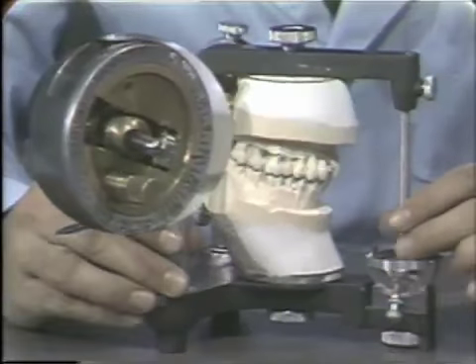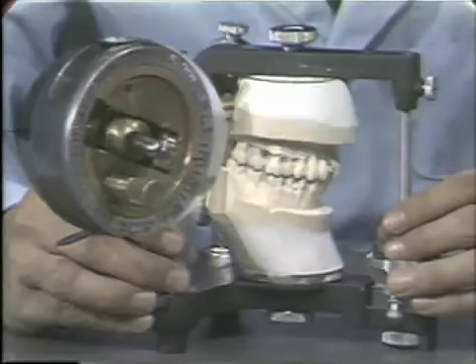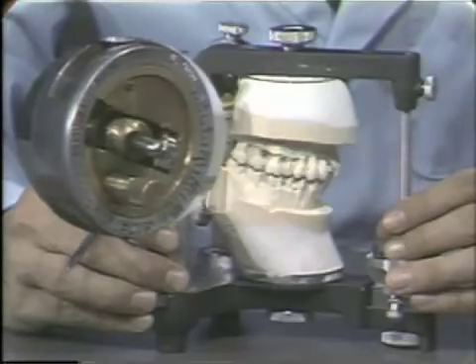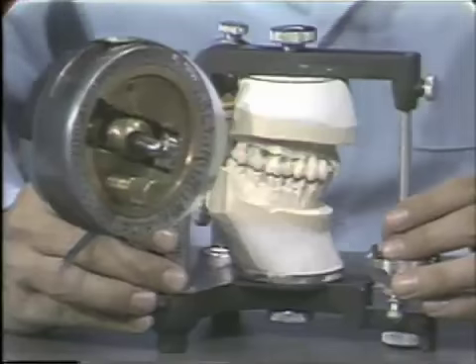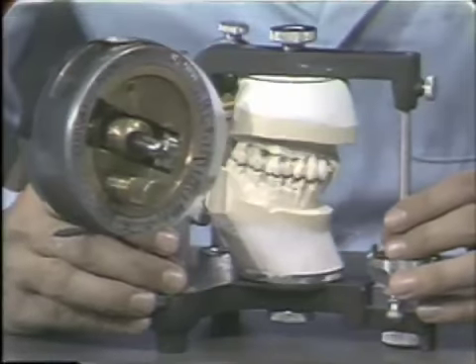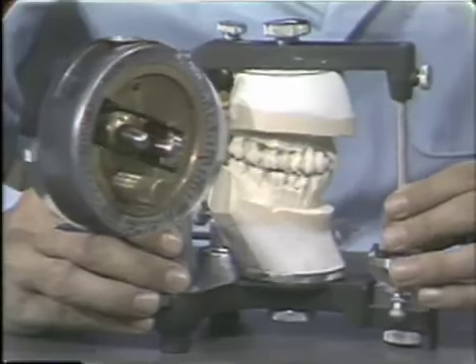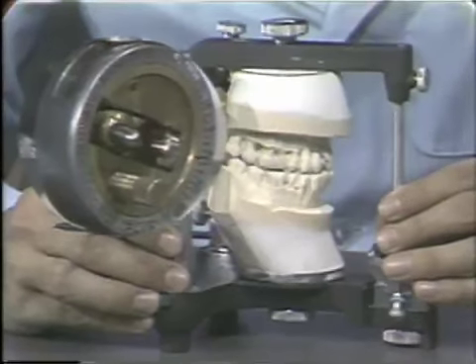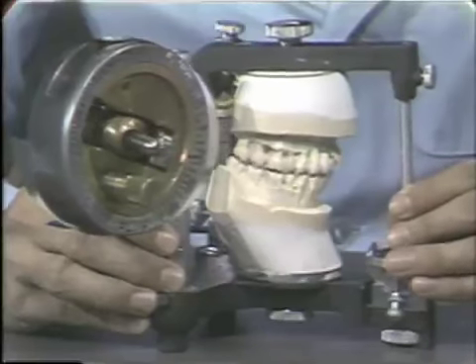This articulator is called a non-arcon instrument, or a non-arcon articulator, because the condylar element is housed in the upper member of the articulator, and if we move it in a protrusive fashion, the upper member of the articulator moves to the posterior. It is the opposite of what we will see happens on the skull, or what we have seen happen on the skull.